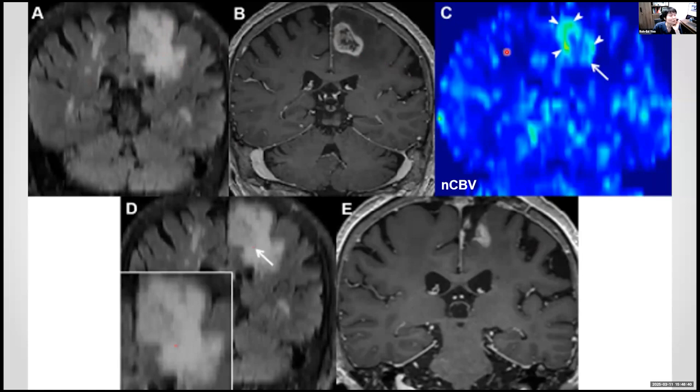And there was a definite increased normalized CBV in the enhancing portion, but also there was some mildly increased normalized CBV at the other non-enhancing T2 hyperintense portion. And the model correctly predicted the area of local progression by a small dotted area, although probably the DICE index was not high, because there's an obvious difference in the area predicted by the model and the true area of the local progression. But still, you can see about where in the tumor the local progression is.